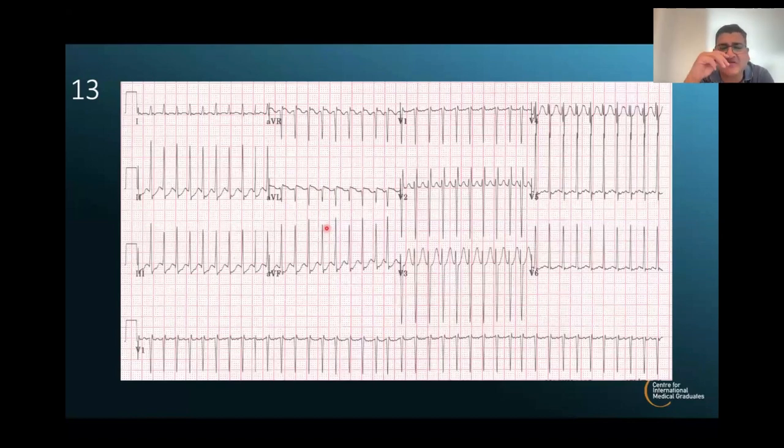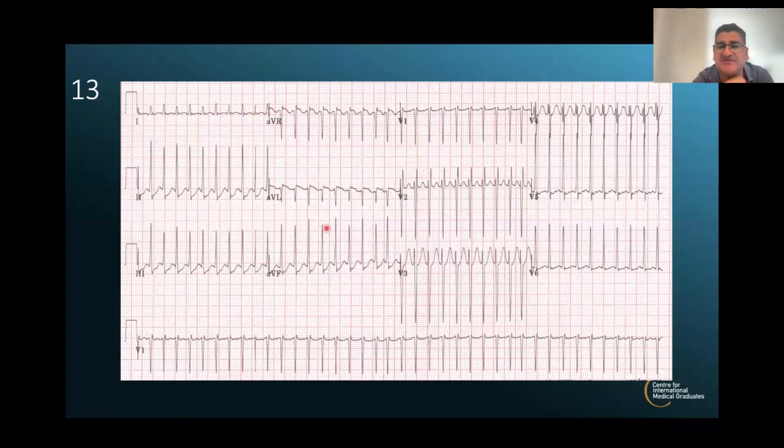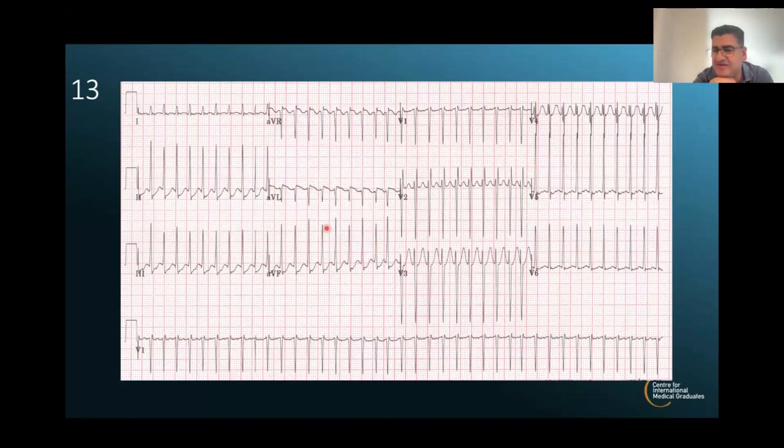Okay, so you think this is SVT on the background of Wolff-Parkinson-White. Does anyone want to give any alternative description? Can I comment on that, please? Please do. Who is this?